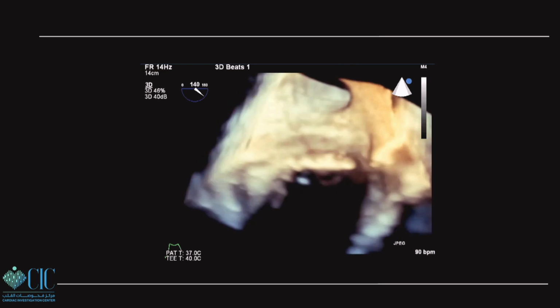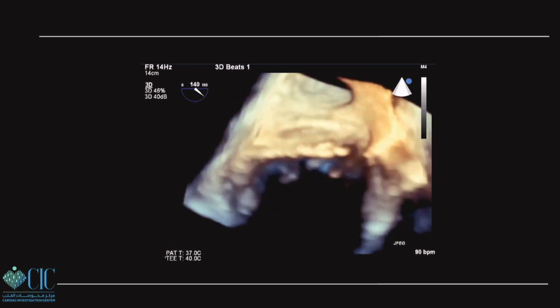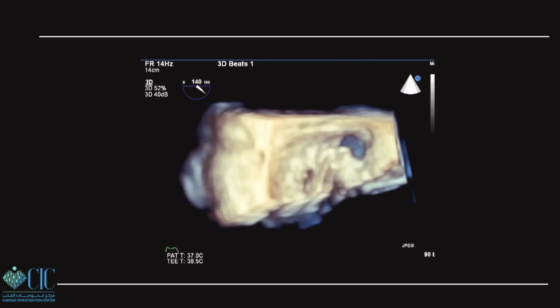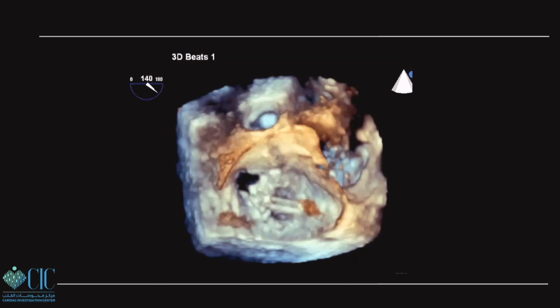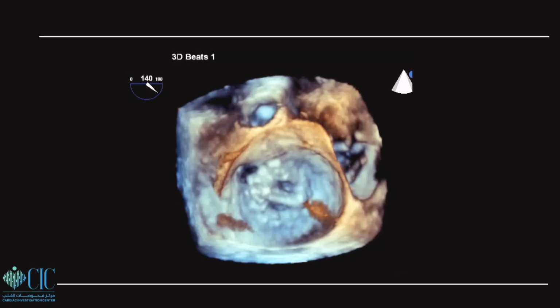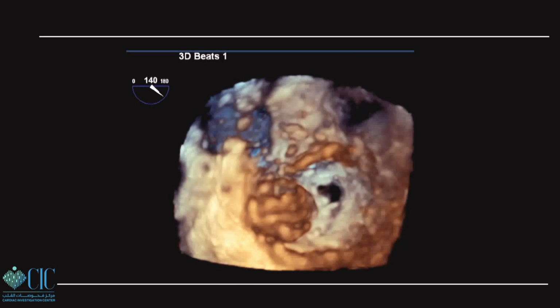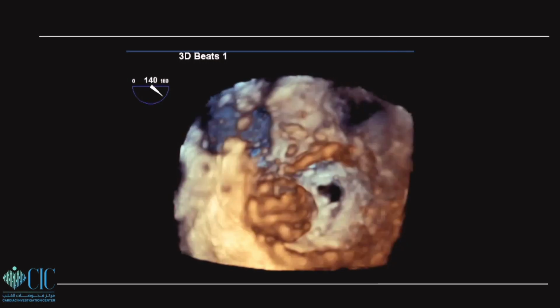And then I enlarge the elevation width, which is, falsely we can say, anteroposterior, the depth of the image. We can increase the thickness. Again, I'm still seeing the defect, and then I orient the image to the surgical view. Now I didn't lose the defect. I have the aortic valve at 12 o'clock position, so this defect is somewhere like 11 o'clock. Do you agree with me? So why is that? This is from down. And again, this is a straight track defect.